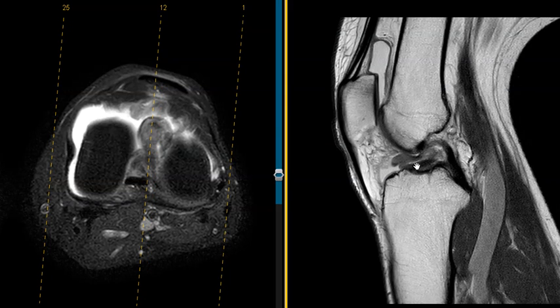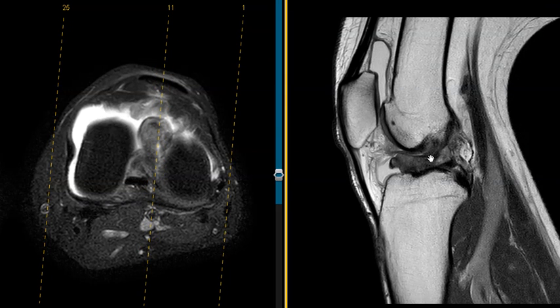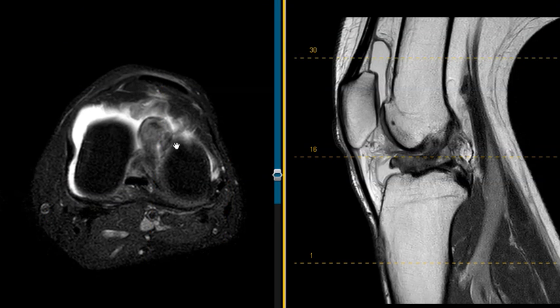In this patient, there has been no ACL repair, so it's a little bit unusual, but you can still get this in patients who have had meniscus tears or prior injury, or even people who have osteoarthritis can sometimes develop this. But this is an example of arthrofibrosis, a glob of inflammation here in the central knee, or fibrosis, scarring. We see it here. It looks rounded or bulbous on this axial view, right here in the middle of the knee. The white is fluid that's surrounding this process.